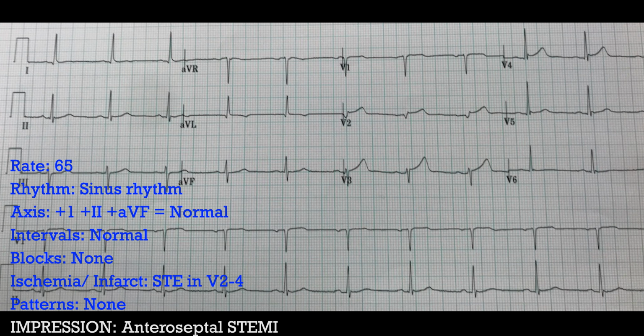It's a little bit subtle, but again, things to kind of hone in on, especially in a little tiny QRS complex with an amount of ST elevation that's as much or more than that QRS complex is. That's concerning. And then a big T wave that's as tall as the whole QRS complex is, that's also concerning. And of course, then there's the clinical condition of the patient himself. All right, that's what we got. Anteroseptal STEMI, sinus rhythm on this one.